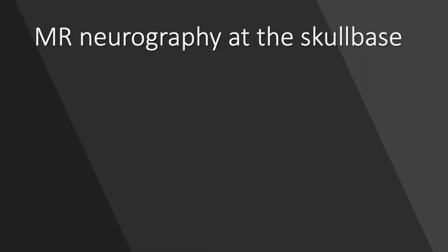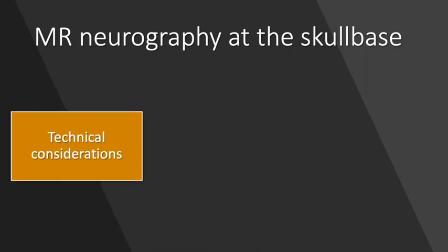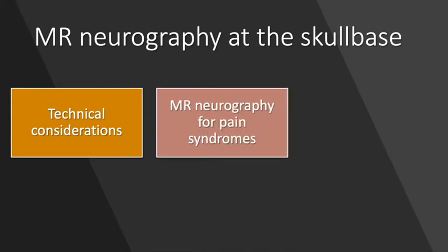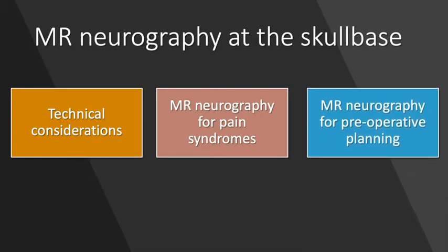I have no disclosures. MR neurography at the skull base is much different than MR neurography elsewhere. So we'll begin by talking about the technical considerations necessary to be able to apply MR neurography techniques to the very small nerves that we image at the skull base. I'll talk about how we at the Barrow Neurological Institute use MR neurography for pain syndromes, as well as how we are currently developing it to be used for preoperative planning for skull base surgery.